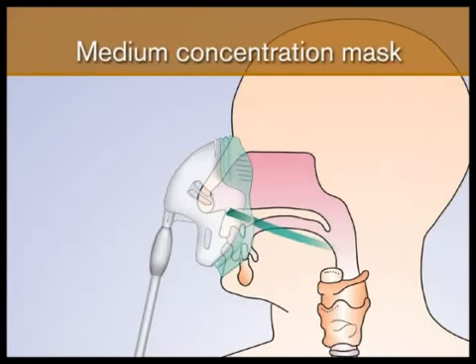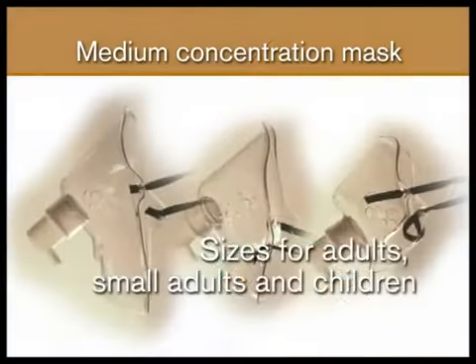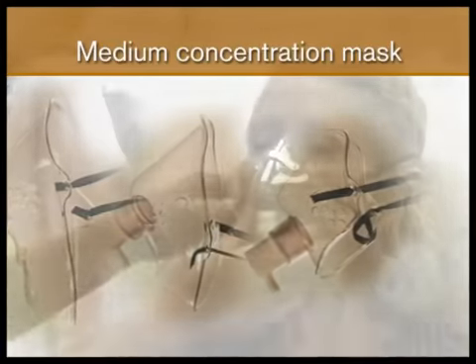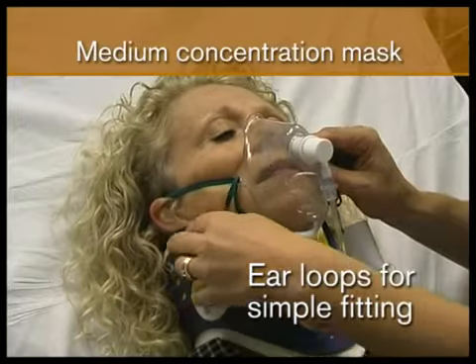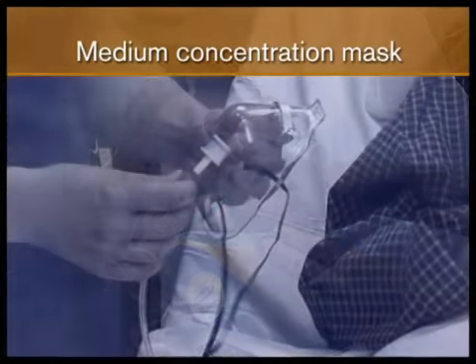However, as a guideline, 5 to 8 litres per minute will deliver between 35 to 50% FiO2 to most adult patients. There are a variety of sizes for adults, small adults and children. Some masks have nose clips to improve the mask fit. Designs are available with ear loops, which make it unnecessary to lift the patient's head when fitting.